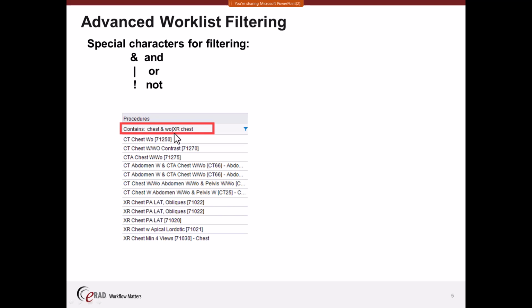So the pipe symbol, I wanted to just tell you real quick, in case you're wondering where that is on the keyboard, because that's sometimes a unique symbol that most people never use for any reason. It's typically above or near the enter key on your keyboard. It shares the button with the backslash. It's above that. So you'll hold the shift key down and press that key to get the pipe symbol if you want to manually use that.